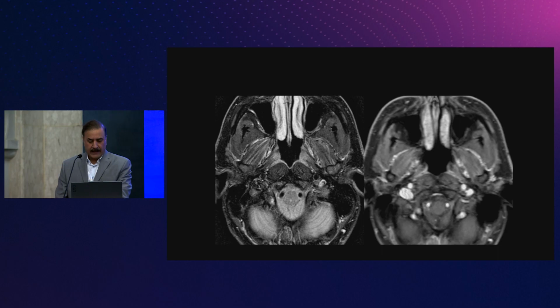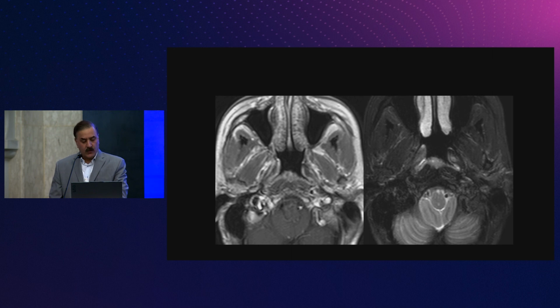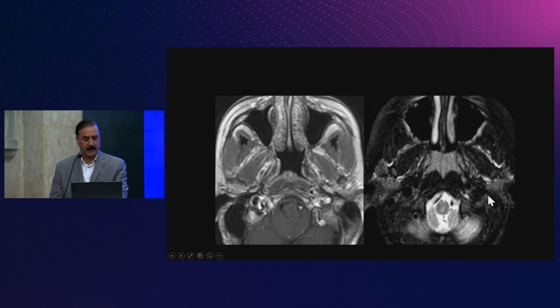If you look at these two different patients, you see normal nasopharyngeal mucosa, very crisp, with no nodularity in both patients. So that's one appearance of the nasopharynx that you will see. Here is another patient. Now you have a little bit of nodularity in the central part of the nasopharynx, a little thickening of the mucosa along the whole length of the mucosa. That's also a normal finding. And this is the T2 of the same image, a little bit of nodularity in the mucosa. You will probably see a small cyst also developing in the nasopharynx at that level.